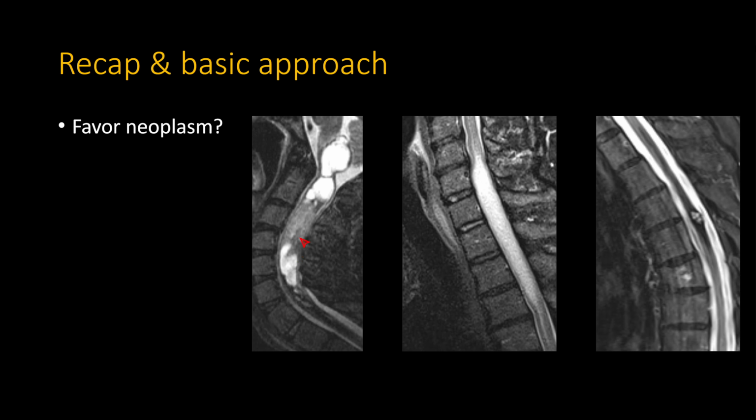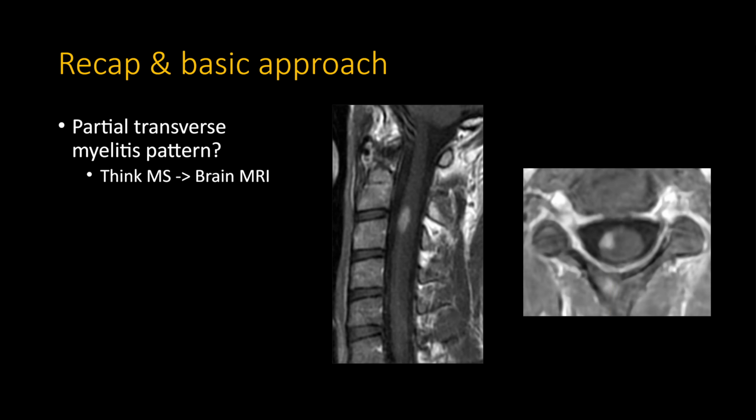So, on the non-contrast, if you have a central area that looks like it could be a mass, that favors neoplasm. Or if you don't have a central prominent mass-like area but you have asymmetry in the swelling, or the swelling seems to suddenly turn off at some point, that probably should favor a neoplasm. And then obviously remember this relatively pathognomonic appearance of what a cavernoma should look like.